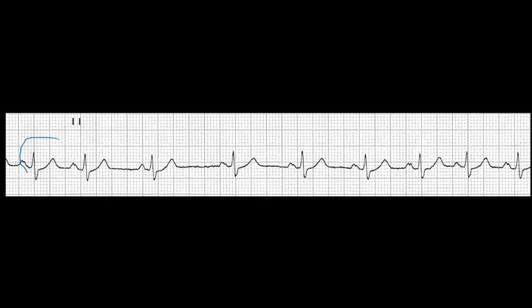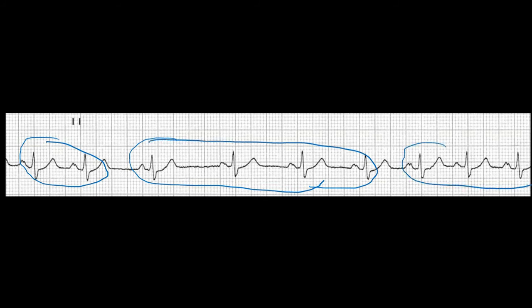So if you take a look at this, and we'll just answer off that part here about that regularity issue. I can almost group what looks like these two. These here, and actually could probably bring that right out to about here. And then you notice that we have another group that appears here. So it looks like these three, and we'll just make sure, right? So we're going to bring our calipers back in.